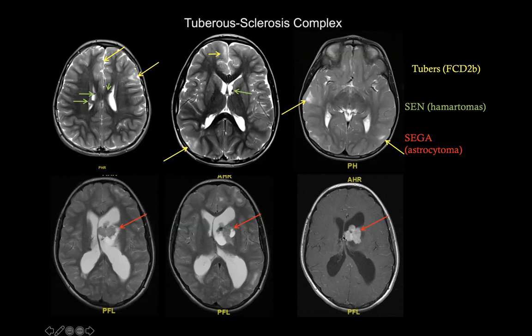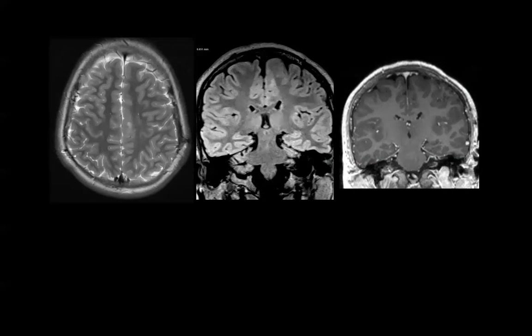So this is tuberous sclerosis complex, and it is a genetic diagnosis, involving the TSC1 and TSC2 genes. Now, when you have an isolated focal cortical dysplasia type 2B, this is a bit of a problem because it's more difficult to pick it up. You don't have a lot of lesions as before. And look here, this is exactly the same histological entity, but isolated.